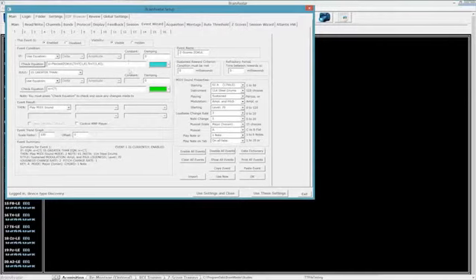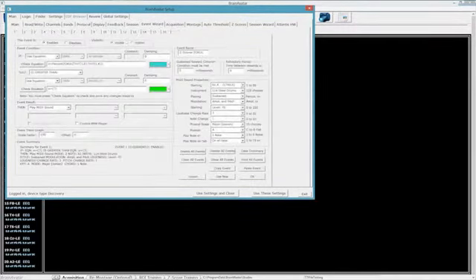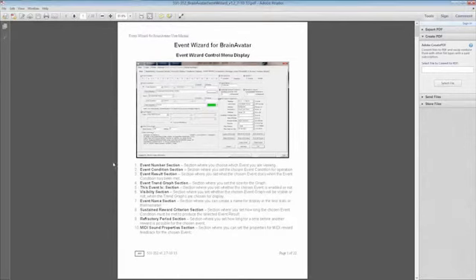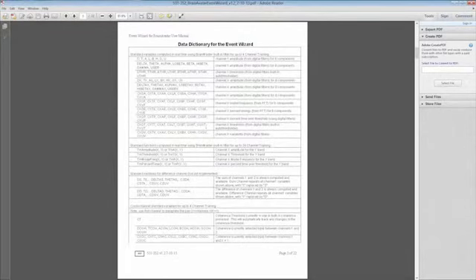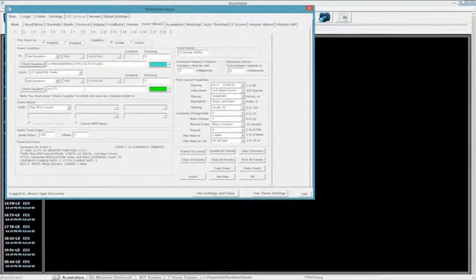So now we've explained that this top portion right here, this event condition, is exactly the same thing as basically saying go on delta. Only now we're using more complex equations that, of course, you can get basically all your definitions or all your information in this data dictionary right here. This has all the different ones you can use, all the different features out of it.